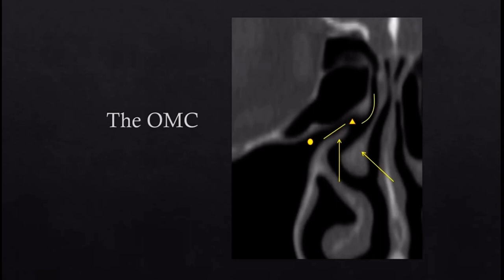Here you can also appreciate the frontal recess, which is where the frontal sinus drains into. And between them all here is the osteomeatal complex. And the point of many surgical operations in the sinuses is to open up the osteomeatal complex to allow these sinuses to drain better.